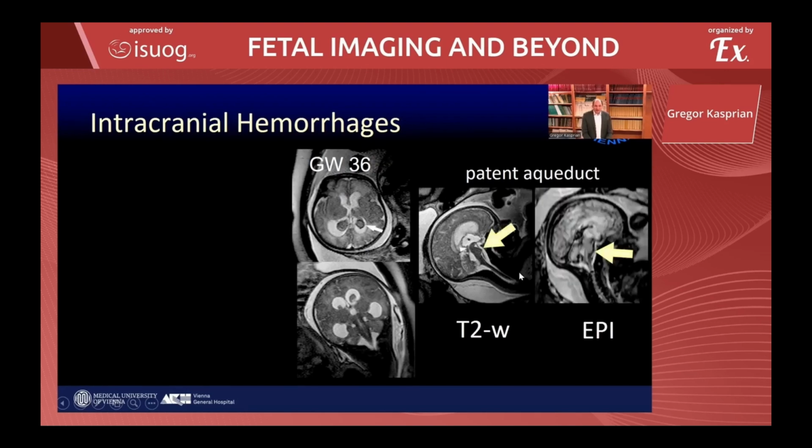What we did not see in all these images is that surrounding the brain, the entire cerebellum, the entire brain stem, and even the third ventricle here, is lined by a dark line only visible on EPI sequences, echoplanar sequences, which was never detected on any other sequence, T2 or T1. This means we have a sequence which basically can see hemorrhage or blood degradation products better than any other sequence. And this is the EPI sequence.